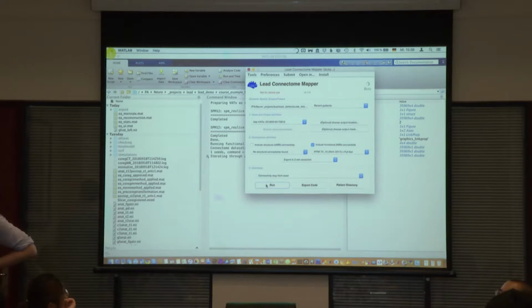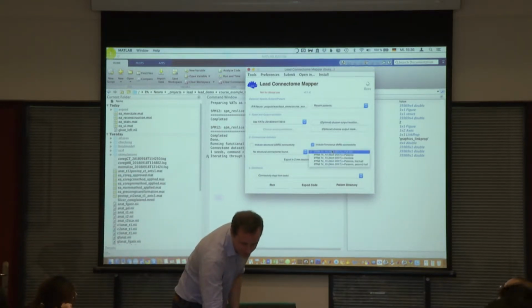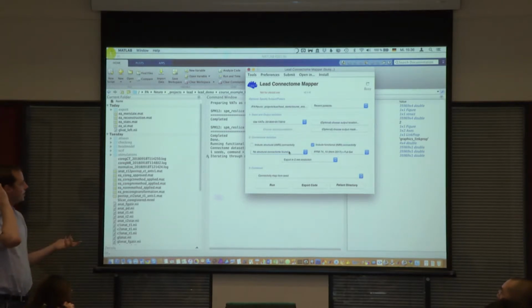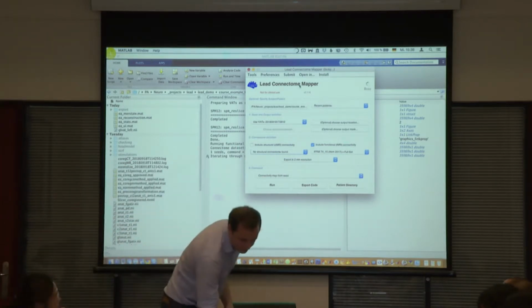You were trying to do it with patient-specific parameters. Yes, of course. With patient-specific parameters it also should work, but it will of course add noise, right? So it's a trade-off. If you have patient-specific fiber tracks here, you should be able to see it in the drop-down, and then you could choose patient-specific fiber tracks, and you could also get a map. Let's see how fast it is.